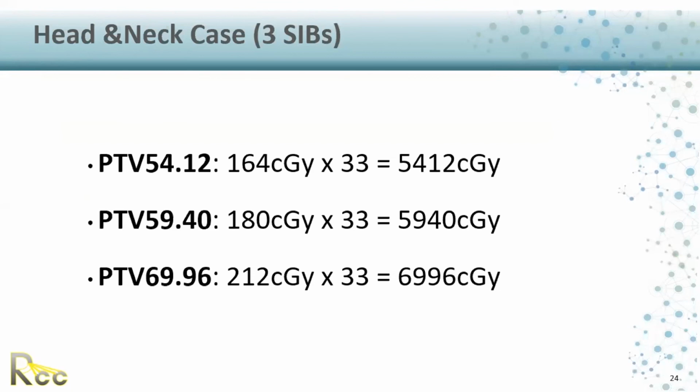But if you put more burden on your optimizer, you can reach up to 4 grays per millimeter. This is usually what I do in my institution. I challenge the optimizer itself, put a lot of constraints, and I reach excellent plans with 4 grays dropped per 1 millimeter. For the pelvis or the abdominal region, you have your PTVs a bit larger, so 2 grays per 1 millimeter is a good approach.